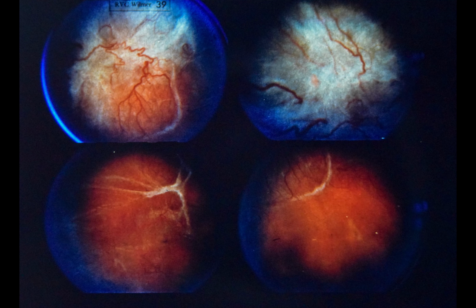Slide 39. Advanced proliferative retinopathy with traction detachment. This 19-year-old white female has had diabetes since age 2. She was examined elsewhere in December 1975, at which time visual acuity was 20/30 in both eyes. Fluorescein angiography showed diffuse capillary changes throughout the posterior pole of both eyes and early disc neovascularization in both eyes. Within 2 weeks, while waiting to be scheduled for photocoagulation treatment, she developed vitreous hemorrhage and traction detachment in both eyes.